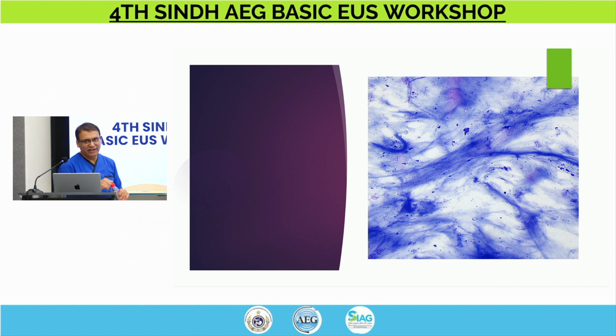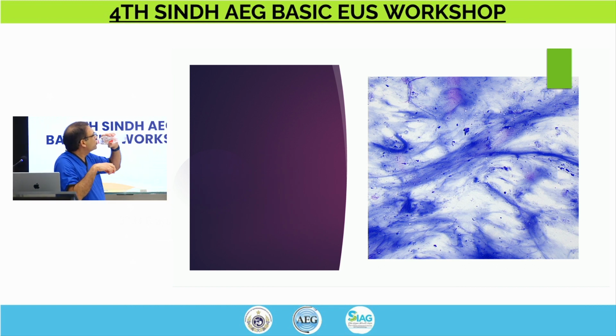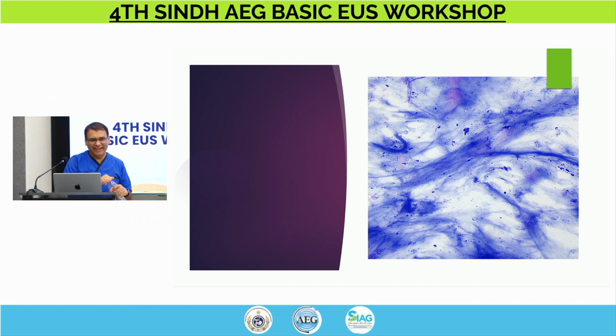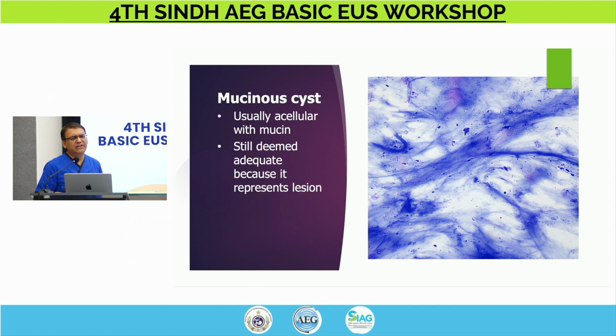What is this? Anybody? Anybody sees any cells there? Nobody says? Not really. Okay. What do you see? I think it's more like the mucin stains like that.